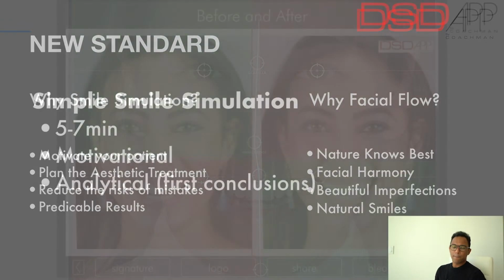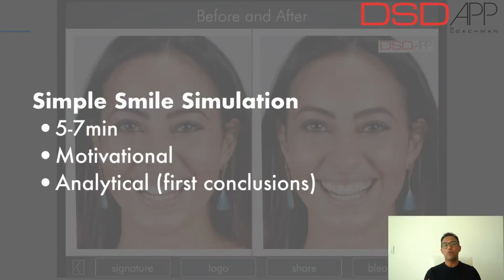And how do we do this simple smile simulation? Remember, in order to create a motivational smile simulation, right now you're not really focused on the measurements or dental terms and terminologies.